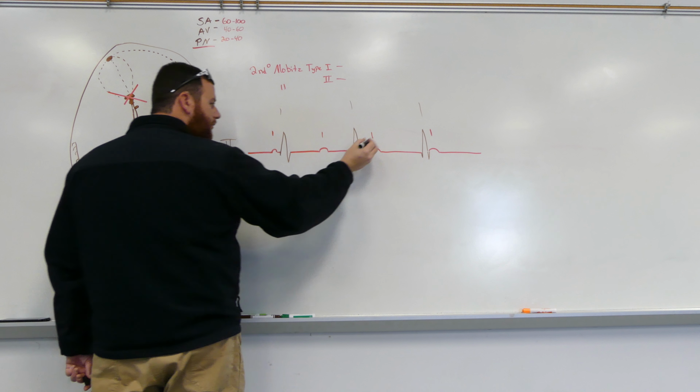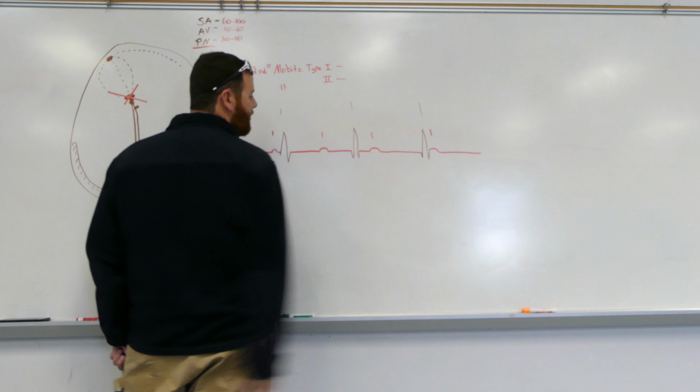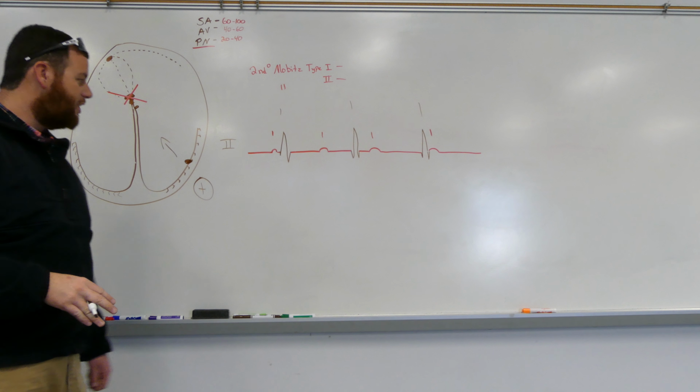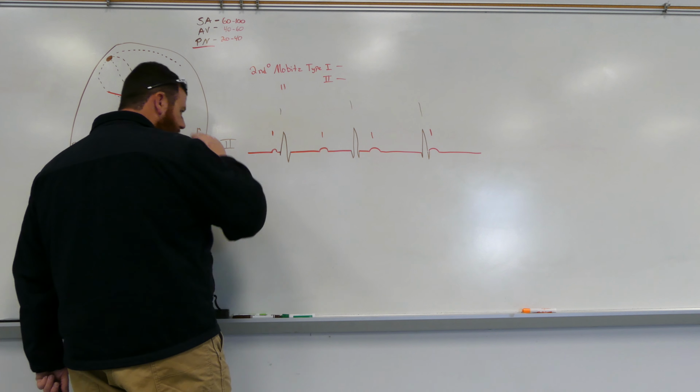The P waves march out with each other. The complexes march out with each other. The P waves and complexes are not correlated in any way, shape, or form. So I have two independent rates.